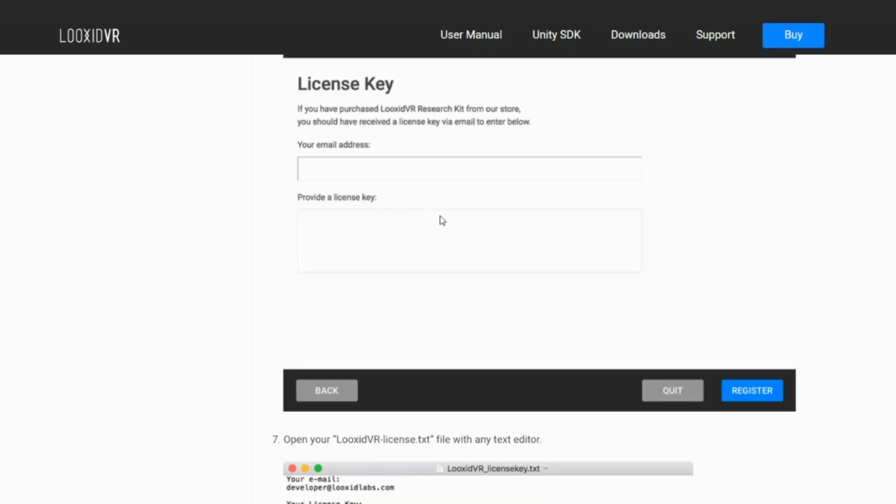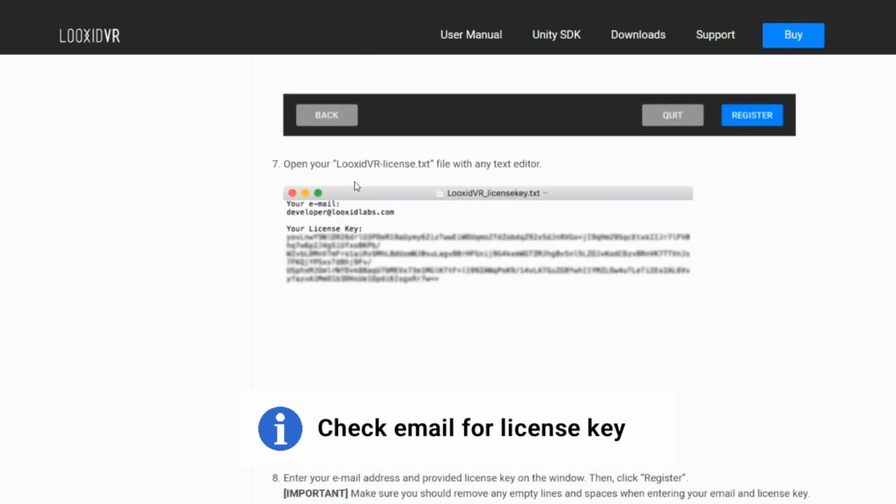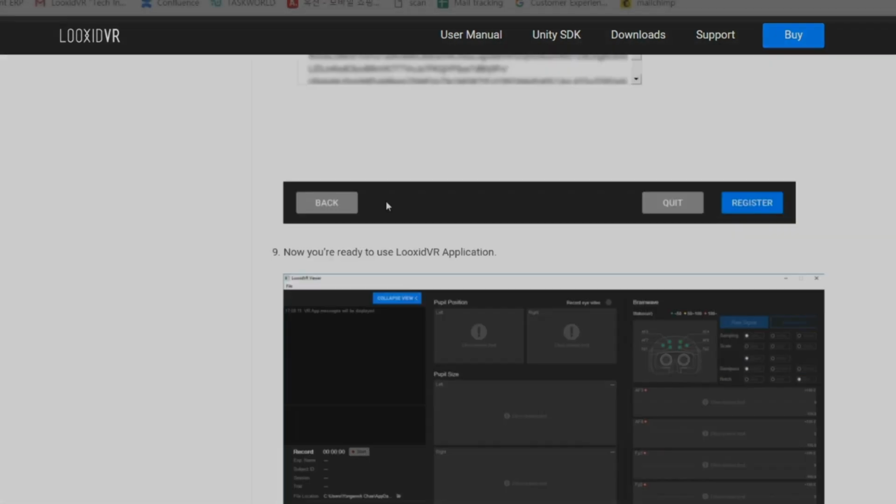Please note that after downloading our program, you'll be asked for a license key which you will have been provided in the shipment email we send you. Proceed to inserting the right information into the respective slots, and your application should be good to go.